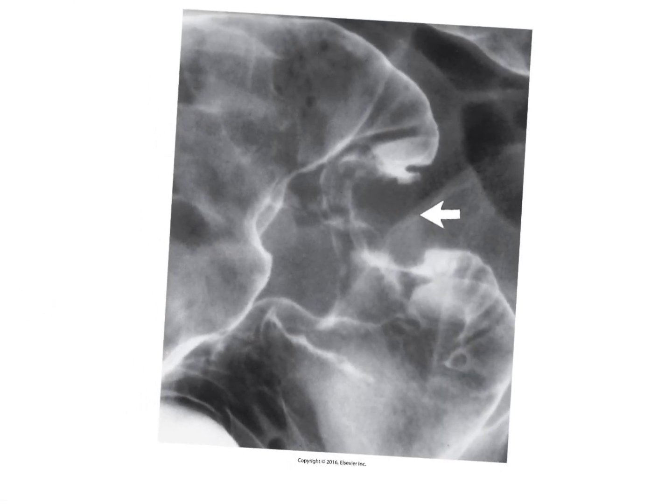On our next x-ray, we're going to look at annular carcinoma. Annular carcinoma is characterized by an apple core appearance. That's what they say anyway. So we can see that this type of cancer has eaten away at the bowel here. So instead of it having its natural lines here, it has, again, eaten away at the tissue in these areas.